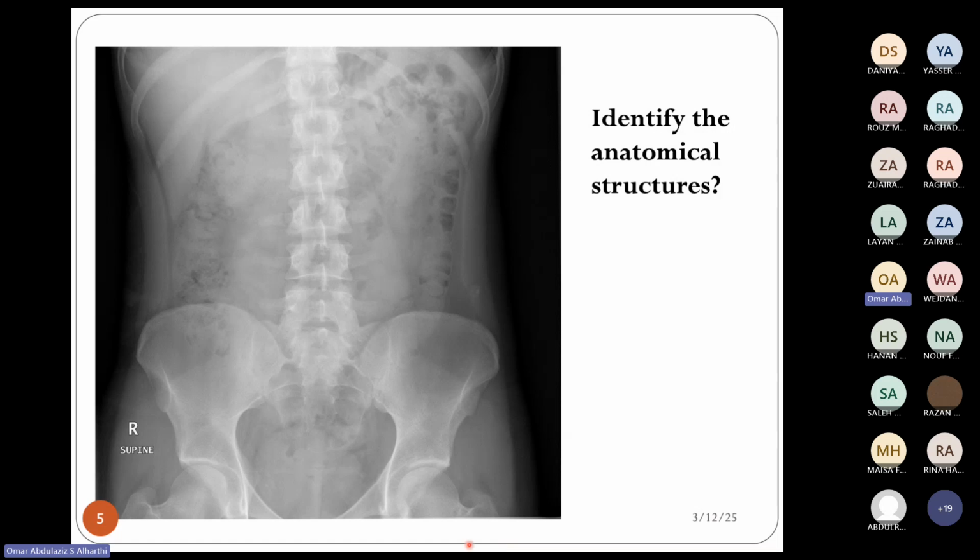What is this organ? One moment. Liver. This line here. There's one here and one here. It extends from here all the way down. Psoas major. Kidney. Psoas major. No, the kidney is here. Here is the kidney. Okay. Psoas major. Okay, excellent.